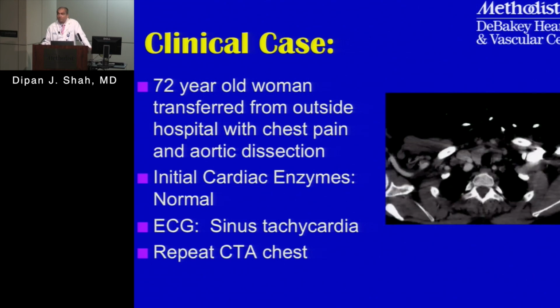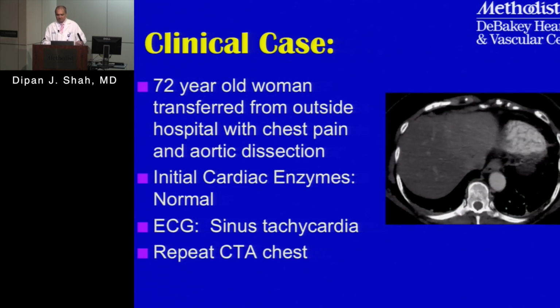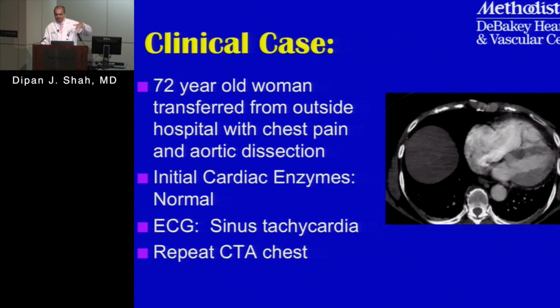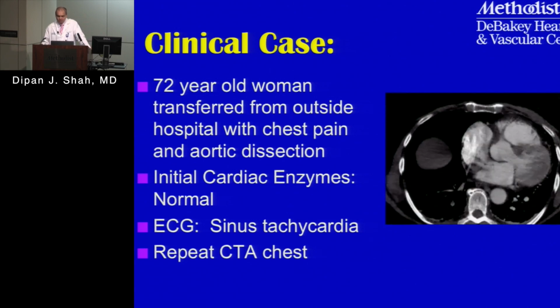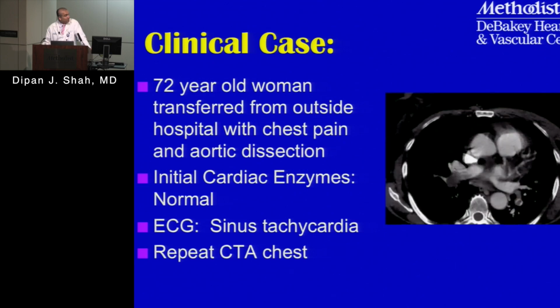Okay, so everyone get a chance to see that? You want to see it again? We're going to cycle through this one more time. So again, these are axial cuts from the abdomen coming up to the neck almost.